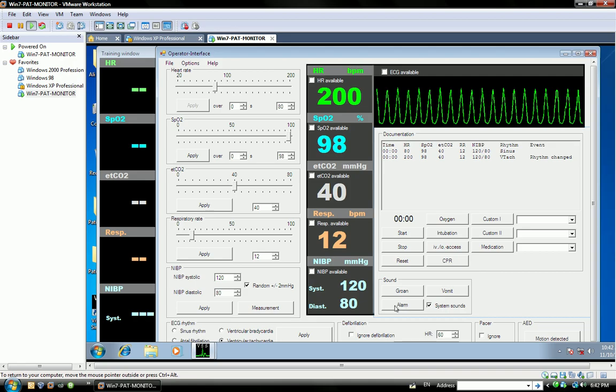An alarm, this is an alarm. This can also be available. Then it can also be used. This is an alarm. This can reflect how a number blinks or how an alarm starts.